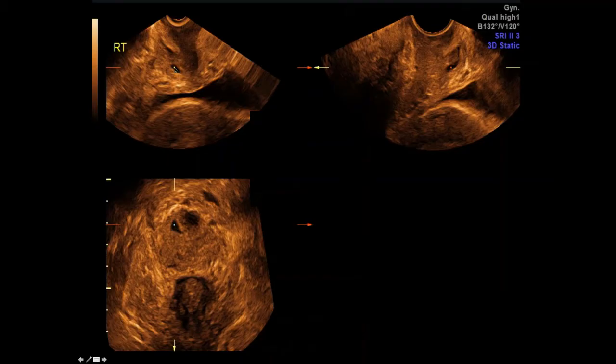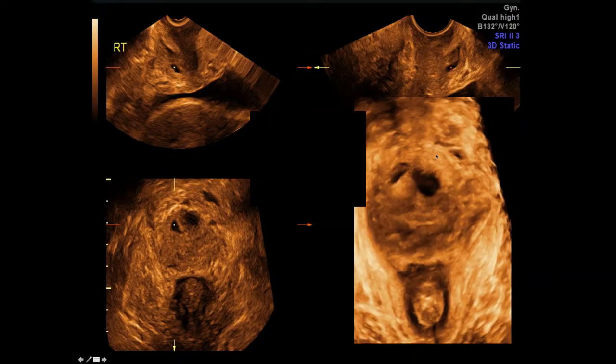Here's one that's very small. This is yet a different one. As you can see, they're pretty common because we have amassed quite a few cases. And so here's the urethra right there. There's a diverticulum. You've got the vagina right here and the rectum. You can see the diverticulum can occur anteriorly, posteriorly, to the side, wherever there seems to be a break in the wall or some sort of weakness in the wall of the urethra. And here it is again, right there.